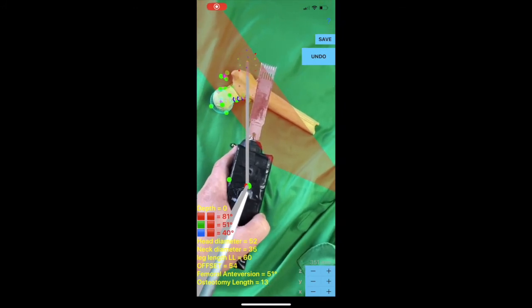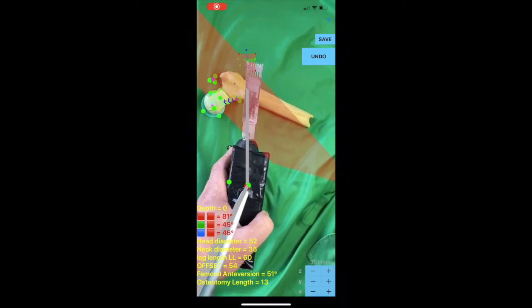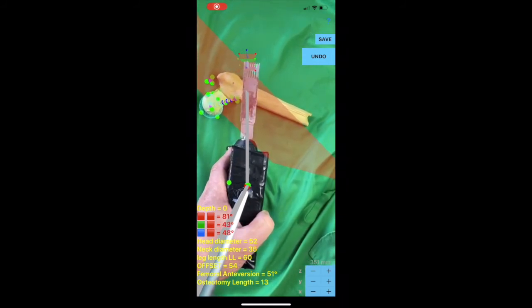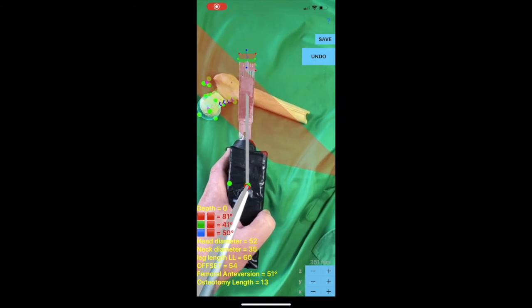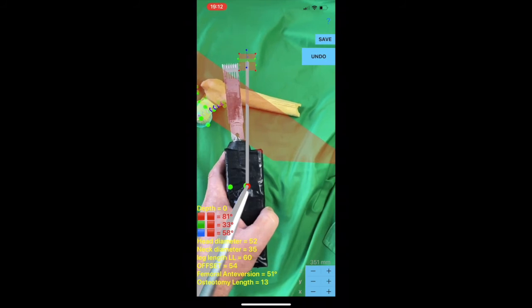The cylindrical tip pointer of the iPhone case probe is inserted and fit into a specially designed cylindrical slot, which is situated over the back surface of the oscillating bone saw cutting machine orthopaedic power tool and impacted securely, which is attached at 16.5 centimeters away from the tip of the center of blade.